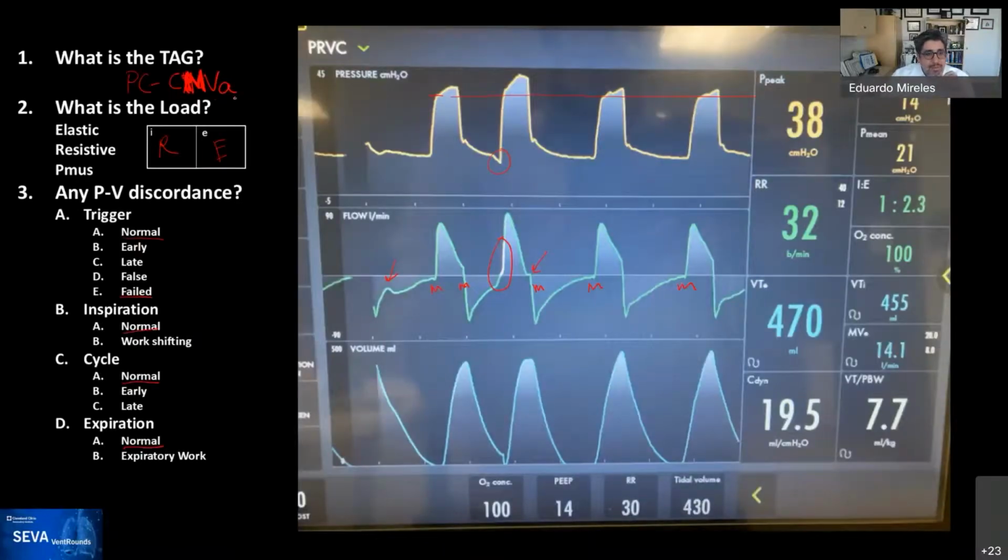Alrighty, so that's adaptive targeting. Just for those that want a refresher on adaptive, remember, adaptive means that you set a target. Here it would be better if it said target tidal volume, and every time you achieve the target tidal volume, I'm going to put a line here to highlight that. If it's touching or around a certain range of that target average tidal volume, the ventilator is going to be happy, and it's going to keep the pressure the same.